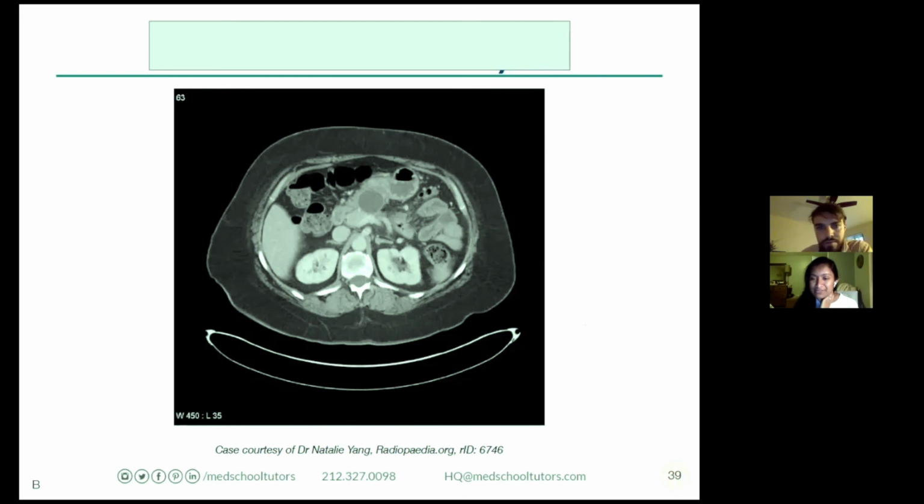We got one person with the right answer already. Nailed it. What else? Anybody else got any thoughts? What do you guys think? Oh, boom, boom, boom. There we go. A couple more. Yeah. So I think the important part here, I think that one person wrote cyst versus pseudocyst.